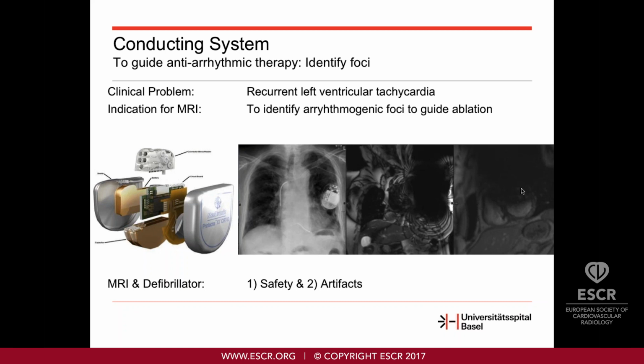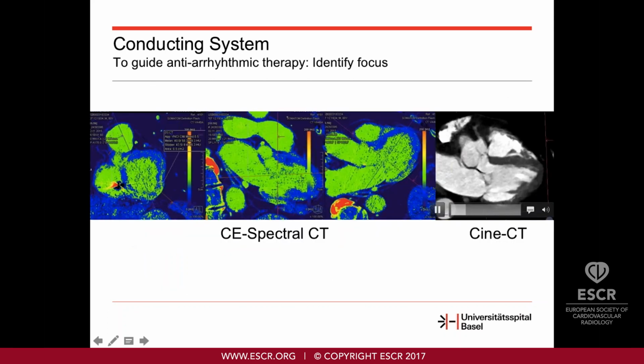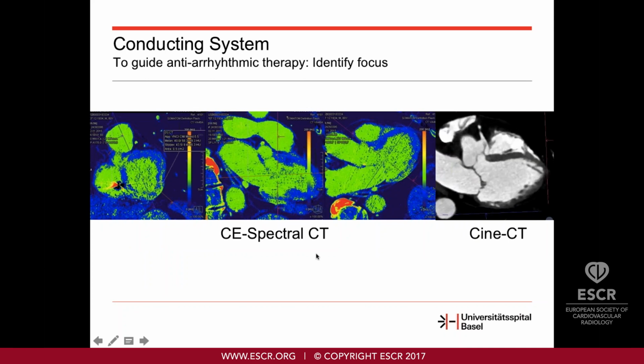So they approach the scar through the lumen or through the cavity of the left ventricle, whereas when they have a subepicardial scar, such as in this case, they approach the scar through the pericardium, so from the outside of the heart. So they did it in this patient, and they confirmed with their electroanatomic mapping the location of this scar, and in particular that it was subepicardial.